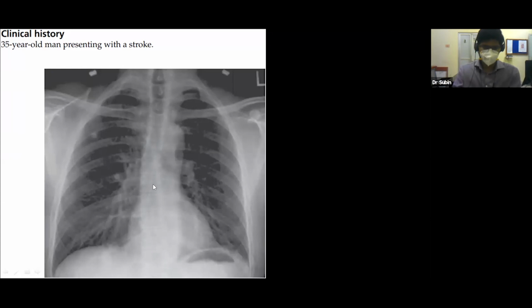I'm sure it's projecting quite decently. It's in the lung. Yes, very good. Right lower lobe. Excellent. Okay, can you see this? You saw that? So there's a lesion behind the diaphragm, the retrodiaphragmatic region. There is this lesion here. Okay, don't forget the review areas.